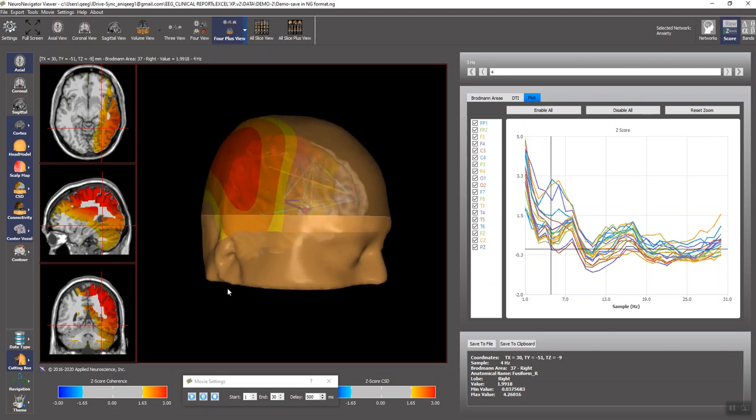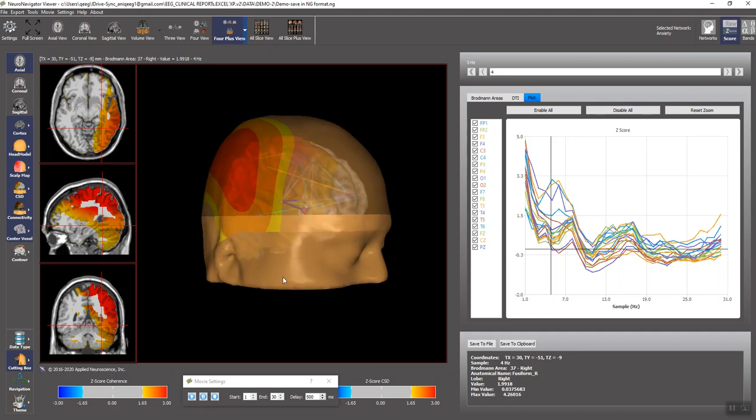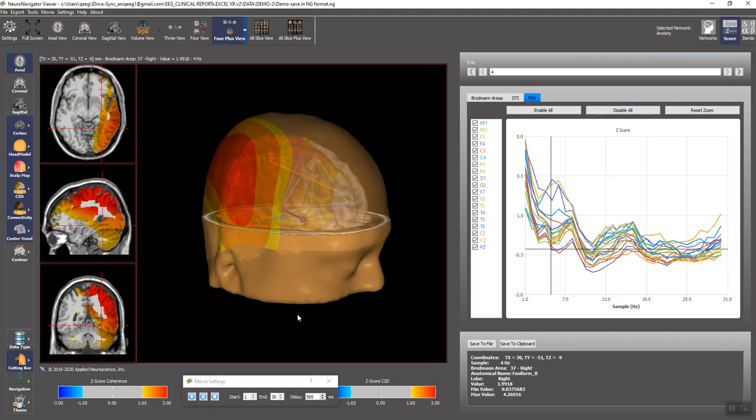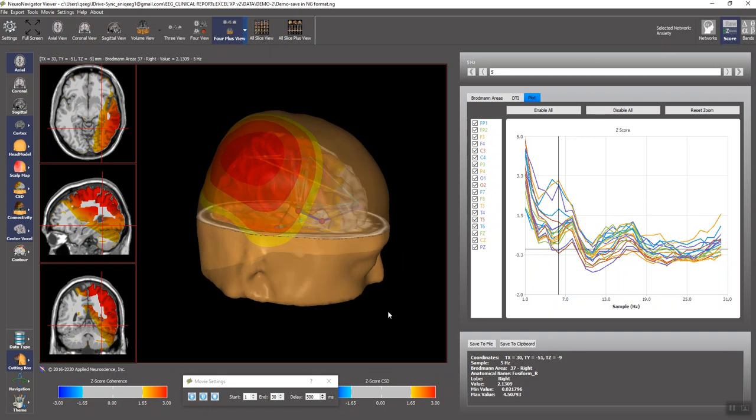and giving a greater control of understanding of going from the EEG at the scalp surface with the patient's symptoms. In this case, the patient is paralyzed on the left and has spatial neglect, does not shave the left side of his face. And you can evaluate the surface EEG and the depths of the brain with greater ease with these new tools.